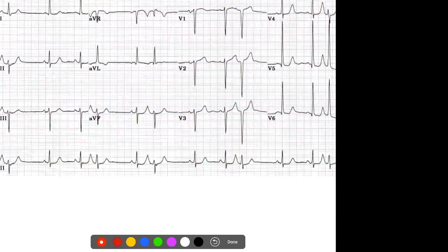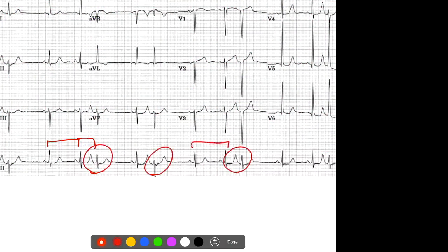I think we've got it on the next slide. Okay. So these are PACs. You have essentially a regular rhythm followed by this beat that comes earlier than it should. So something weird's going on here. Those are kind of paced out, and you've got these outliers here. You can see that the T waves of these look different than that, and that's because those P waves are hiding inside of here.